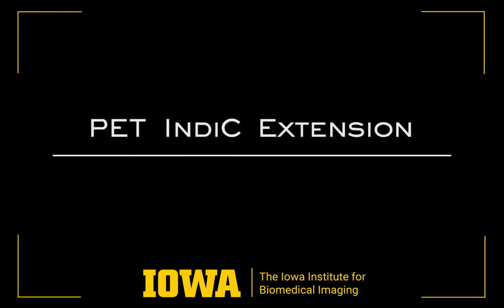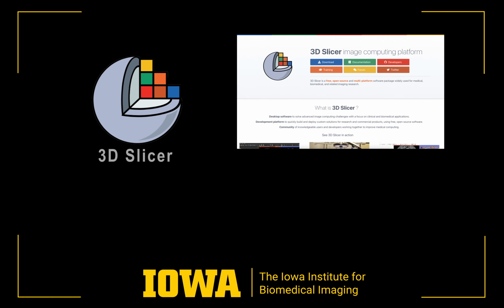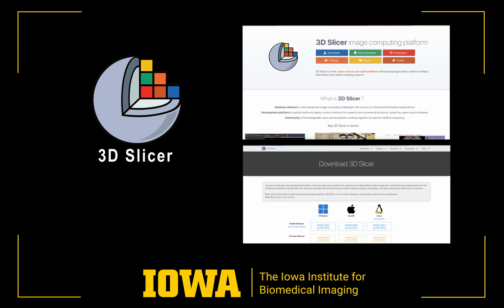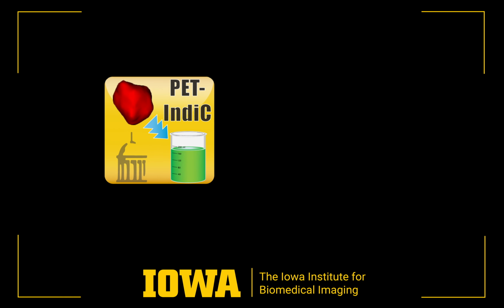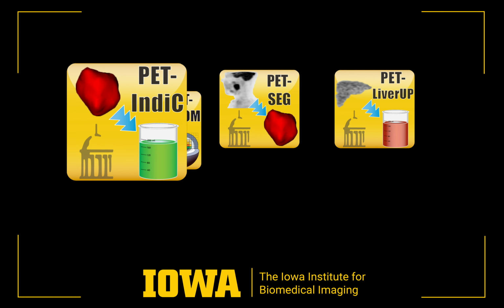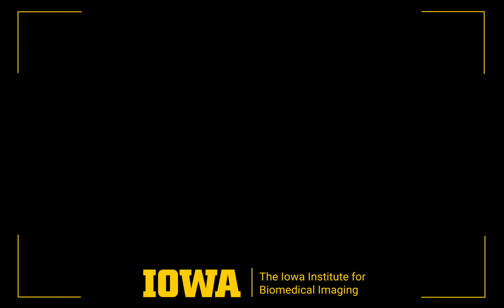In this video, we are looking at the InDIC Extension for 3D Slicer, a multi-platform, free and open source software package for visualization and medical image computing. This extension allows calculating quantitative indices of PET tracer uptake from segmented structures in PET scans. It is one of a suite of publicly available tools developed at the University of Iowa. This video will cover installation and usage.